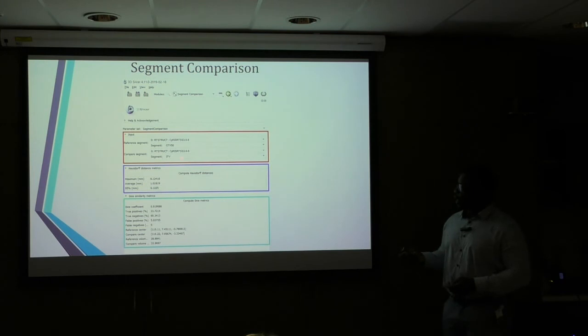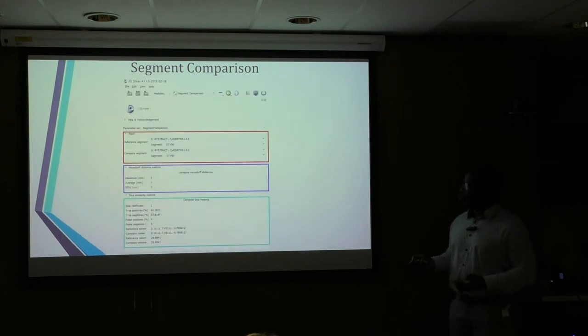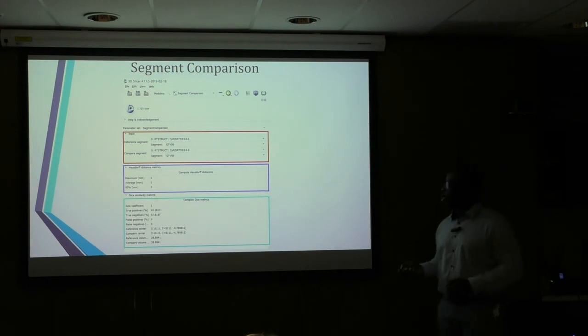The results here are for an ITV and a GTV. Generally you would not compare these 2 structures. I've just put it there so you can see. When you compare a GTV with a GTV, you get obviously perfect similarities.